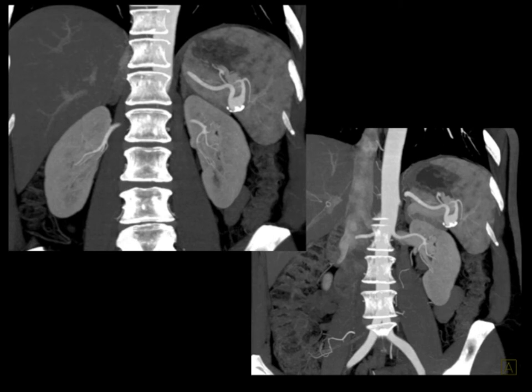Just a beautiful example. You really recognize it when you go to the 3D, and you see there it is, the splenic artery aneurysm, partially calcified, and it was just sitting in the perfect position to simulate a tail of the pancreas lesion. This patient was very lucky. They had the aneurysm resected. There was no need for pancreatic surgery because the patient had no pancreatic pathology.